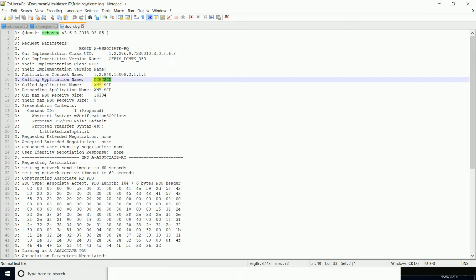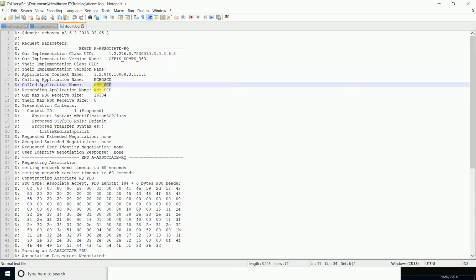It's going to use the calling AE title, which is the default. We didn't specify one, so the default is going to be Echo SCU, which is what it is. And then for the called AE title, we didn't specify one, so we put that as ANY-SCP.